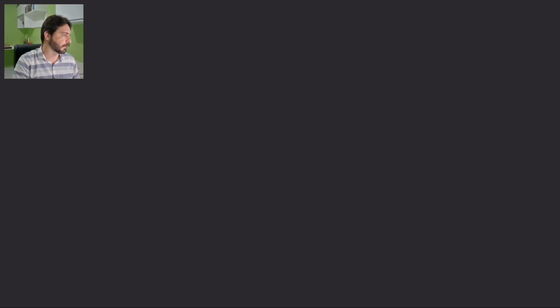We're gonna have to wait about 20 seconds for it to download. Let's see if we can figure out why this exam was ordered in the first place and hope for something that makes sense. So it's loading up. The exam is here.